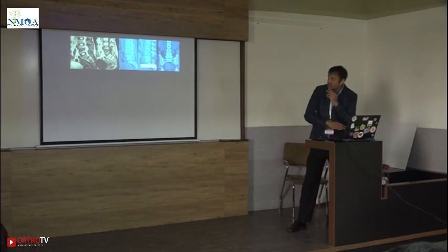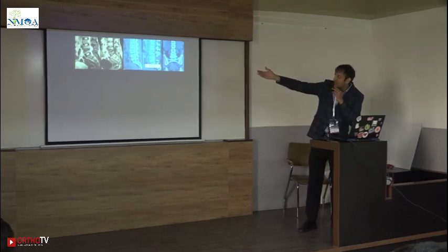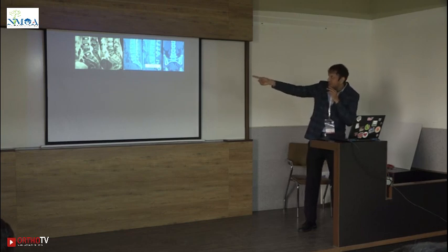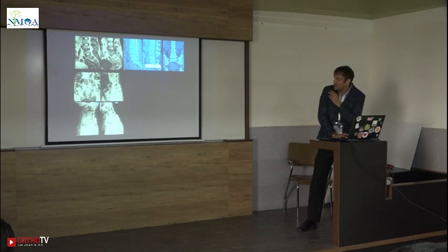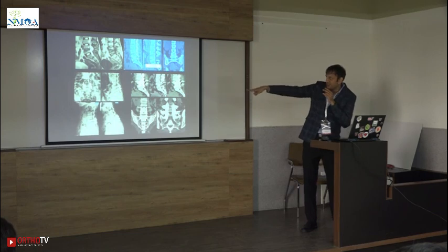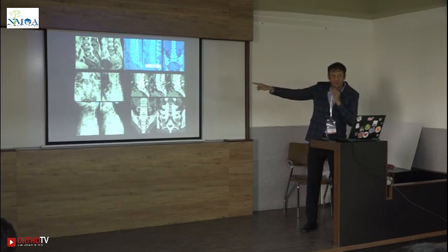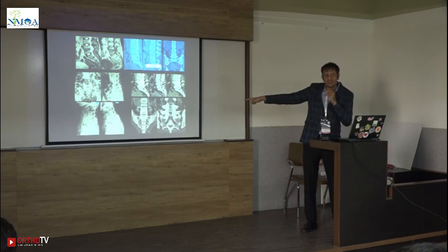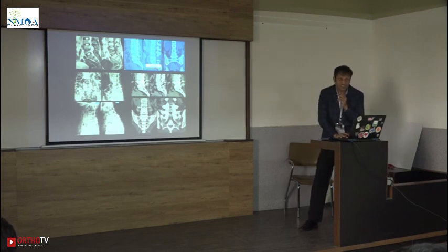Coming back again, this is a classical primary spondylodiscitis. The CT actually shows the void which is present. This patient underwent an in situ fixation without any grafting, without any reconstruction. That is his X-ray at 2 years, but you need documentation of the CT just to show that it has united without putting anything inside the space, without debriding, just taking tissue culture and biopsy. What it also shows at 4 years is that there is autofusion posterolaterally as well. This is why CT is important to document fusion.